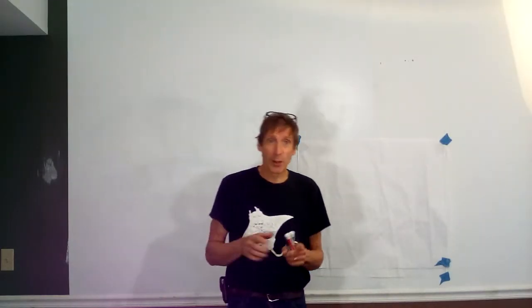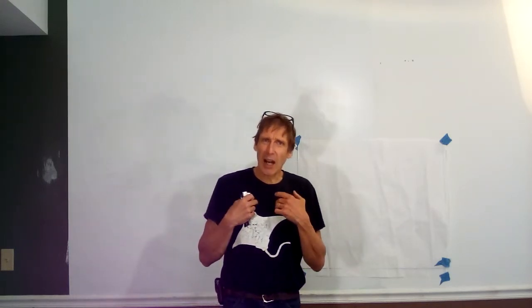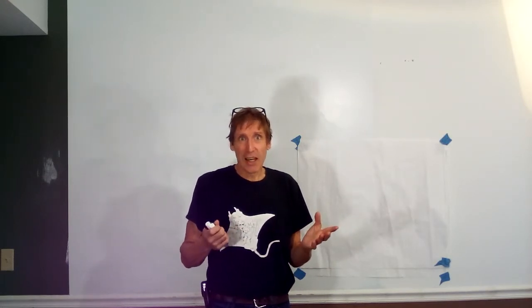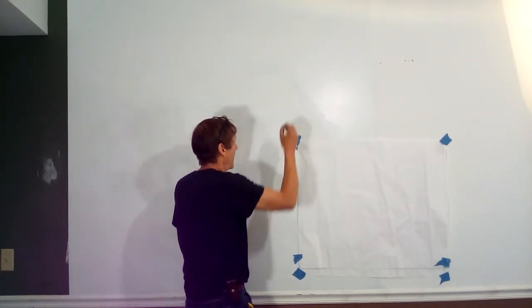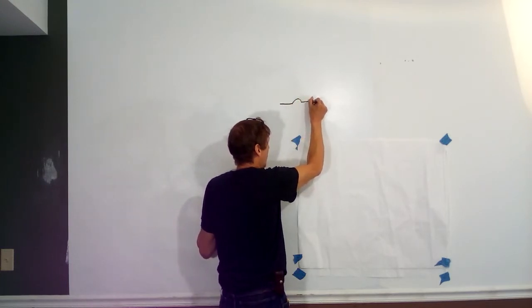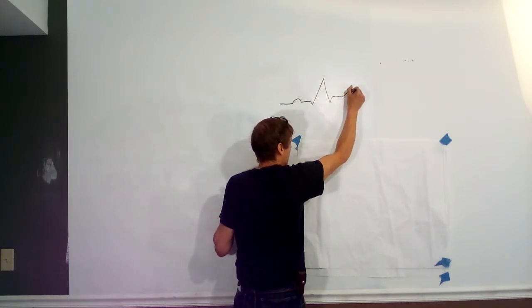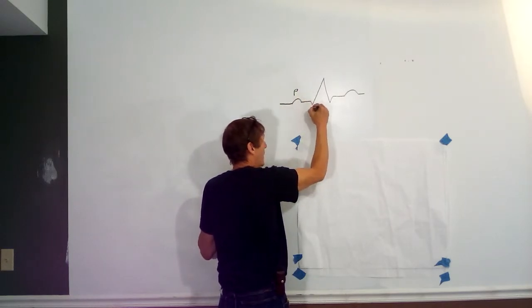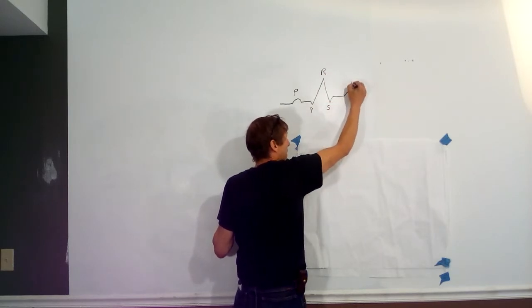Alrighty, this time we're going to look at some abnormal EKGs. Last time we went over the normal timing and flow of the electrical signal through the heart. We looked at more or less a normal EKG from lead 2, which looks something like this. No times or anything on it, but that's your P wave, Q, R, and S complex and the T wave.